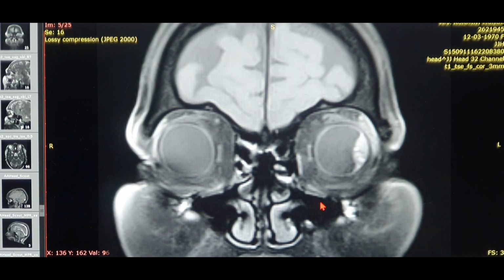That's the maxillary sinus over here. We see bone as black and air as black, so we need to differentiate properly which is bone and which is air. We can clearly see the bone over here. That's the demarcation line. In cases of encephalocele or olfactory neuroblastoma, for which I have MRI images as well, I'll show them to you.